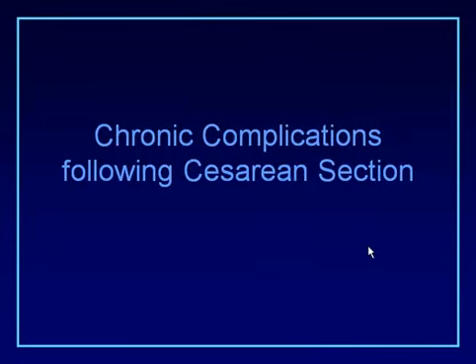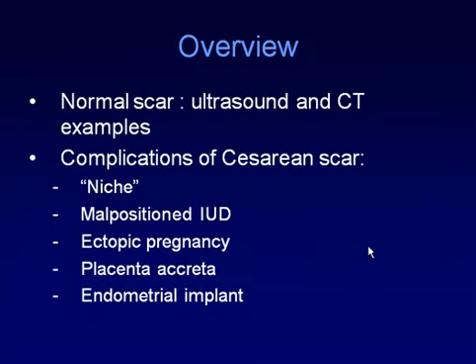Now we'll turn to chronic complications following cesarean section. So these are patients well out of the immediate postoperative time period. We'll look at what the scar looks like long-term after cesarean section on both ultrasound and CT, and then a variety of issues related to that scar.